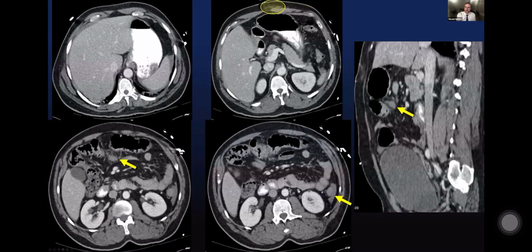This is one case like that where the patient was stabbed in the epigastrium. You can see that there is a small amount of hemoperitoneum, and there's blood within the colon here, or at least posterior to it in the colonic mesentery. And so just like the small bowel mesenteric injuries, it's important to pay attention to distribution of blood. Spaces matter. And remember that sometimes stab wounds in particular can be quite subtle.